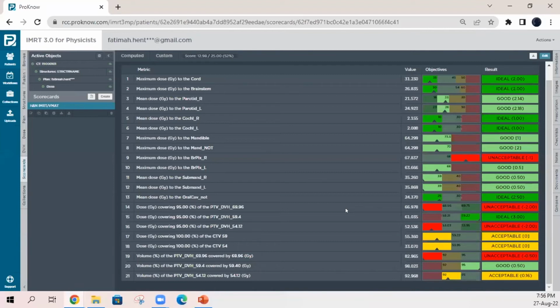Use the normal tissue objectives. It's very important, and maybe we can talk about this in detail. There is a lot of things embedded in the normal tissue objectives. You have to know which parameters are there, what to use, how to drop the dose at the edges, and so on. Also the rings, they are very, very important to use. And please remember, the mean dose is the easiest one to achieve, and the hardest one is the maximum dose, which goes to the serial objectives.